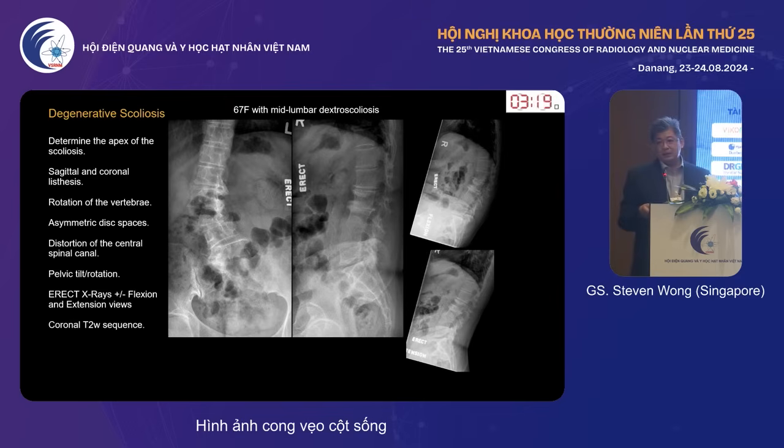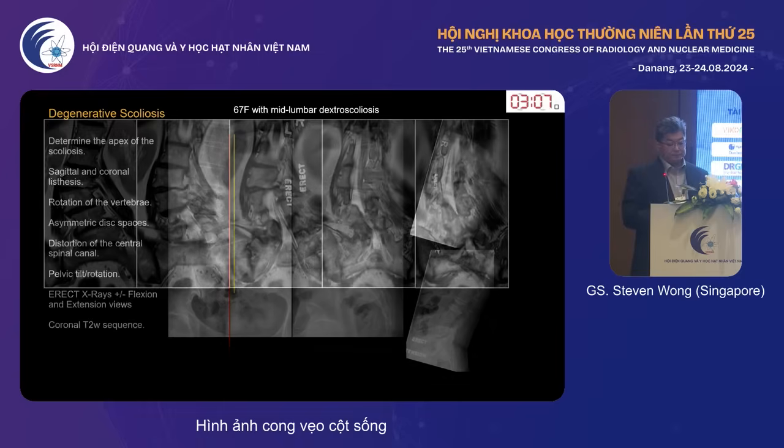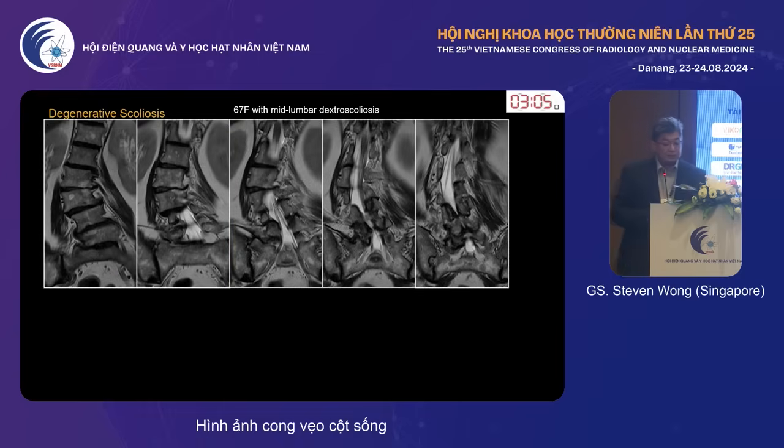All this will mean that it will never straighten itself. It will just get worse. Eventually, the patient will end up with pelvic tilt because of the tilt of the body towards one side or the other, and just get x-rays, okay? Right. So for this patient, I would advise when they come for MR, do a coronal MR sequence.